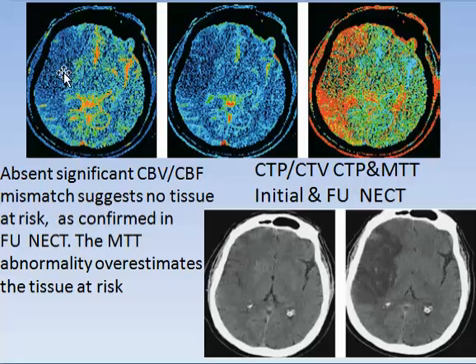That means that the core has no penumbra. There is no tissue at risk. This part is infarct, and only this part is infarct. And this is confirmed in non-contrast CT scan on follow-up. This is the follow-up CT scan, non-contrast. It shows the same area of infarcts.